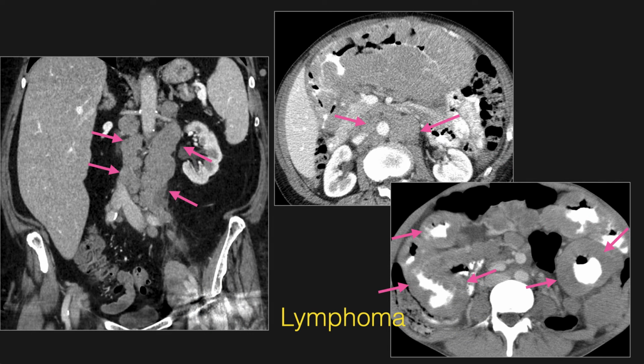Stomach infiltration is usually not the only manifestation of lymphoma. It is very helpful to tie it all together by looking for hints in the other organ systems. So if you're puzzling over a stomach finding, take a break and complete your search pattern by looking for adenopathy, organ infiltration, or other sites of disease in the remainder of the GI tract to help you make the diagnosis.